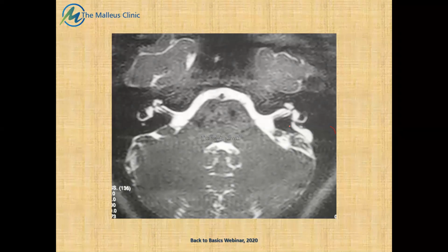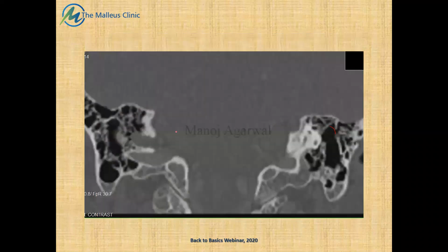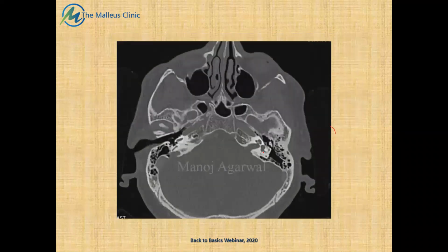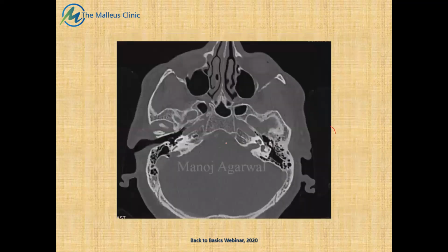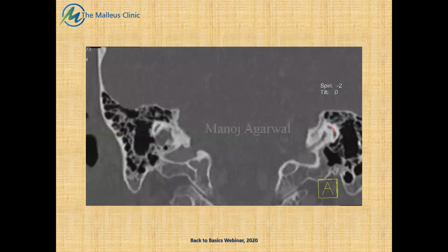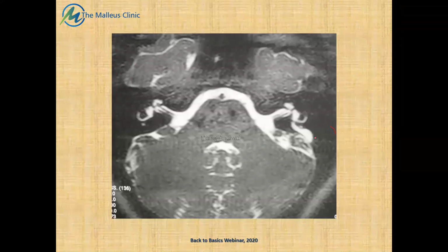This is an enlarged endolymphatic sac on the left side. The appearance is much smoother compared to what we had seen here, because endolymphatic sac tumors are low-grade adenocarcinomas, which are locally malignant, causing a lot of bone destruction.